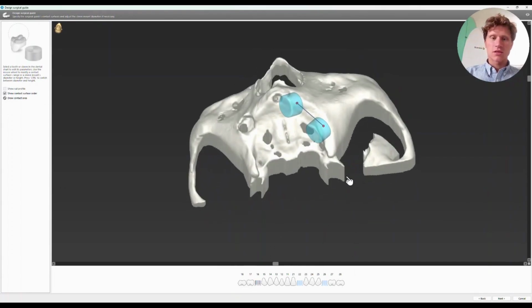It depends which materials you will use. If you will print your surgical guide from the metal, sinterize it from the metal, you can make this really, really thin. For example, we have the wall, the diameter is 5 millimeter, right? And we would like to have wall maybe 2 millimeter of the sleeve. In this case, I can make it 7.